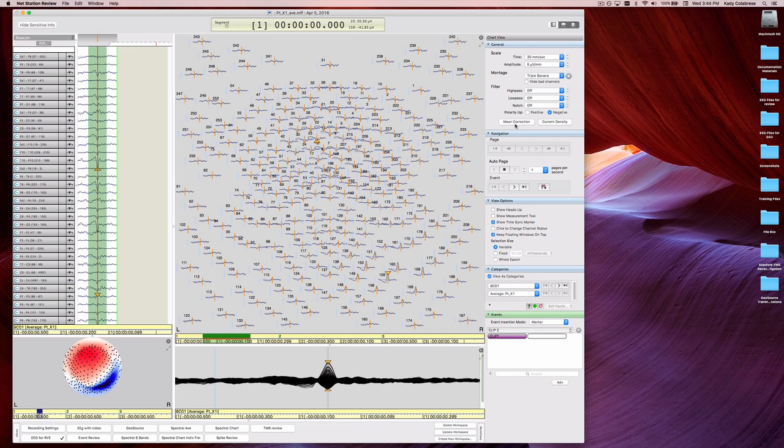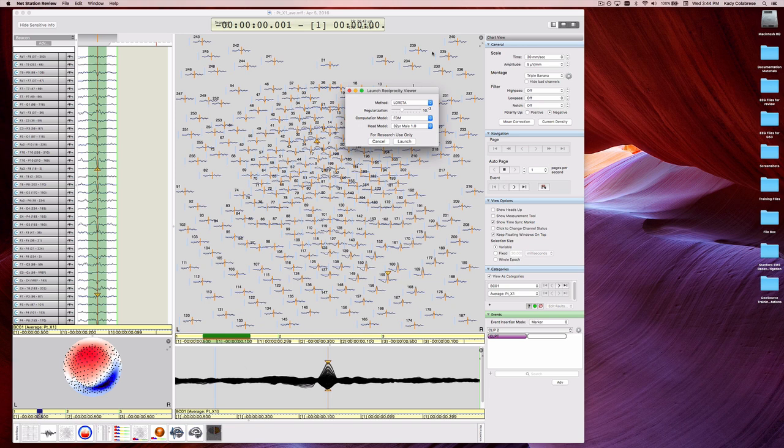Click the View button in the bottom tray to bring back your viewing options. Click on the Reciprocity Viewer icon in your Views menu. Select the options for the imaging specification. Choose your constraint for the inverse algorithm.